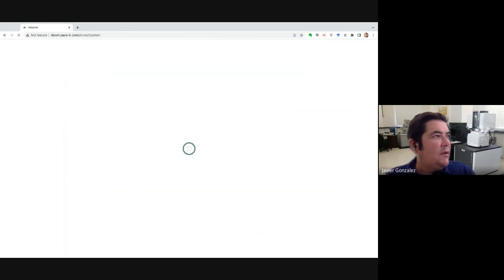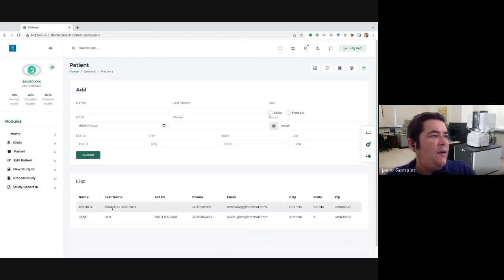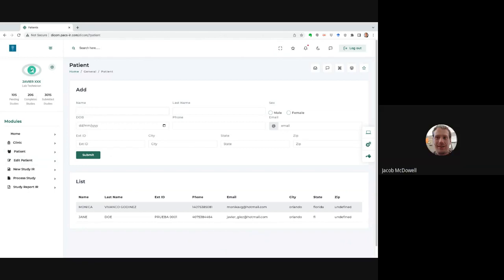The next thing is to load a new patient into the app, right? Here in patients, I have already the ones I've uploaded in the past, but you can upload a new one. For example, let's say we want another Jane Doe. Jane. How about Jane Buck?